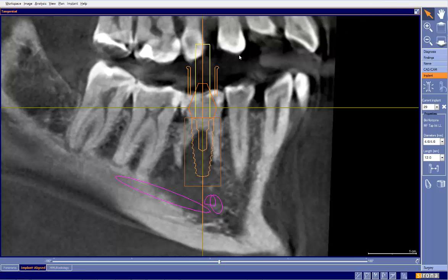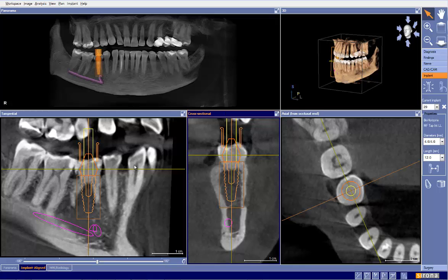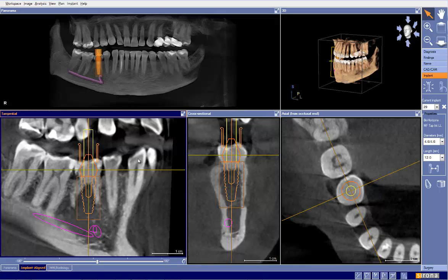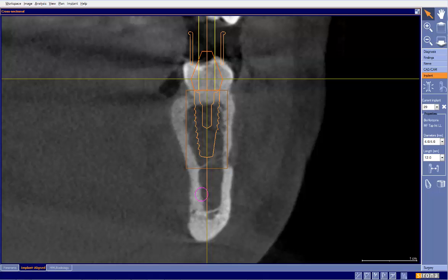So we can often see this in the necks. If we take a look at a picture of this tooth, if we had that, we would see that the neck of this tooth is not as low or as apical as the adjacent teeth. So one of the things that we have to do in this case is plan this a little bit deeper. So if I were to critique this case, I would tell you that what I see as the bone level here would be something along this line, like so.